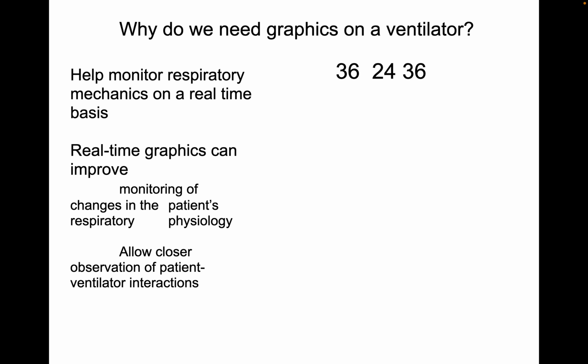And this is the classical pressure volume loop, and this is the flow volume loop, which looks like this. The wave which is above, the positive deflection, is inspiration, and negative is expiration.